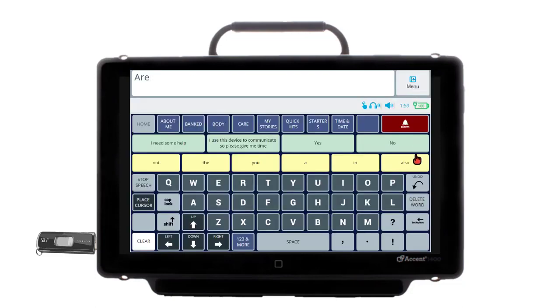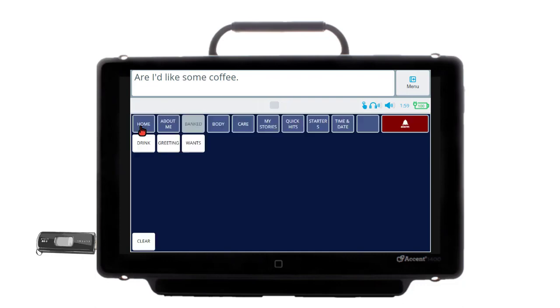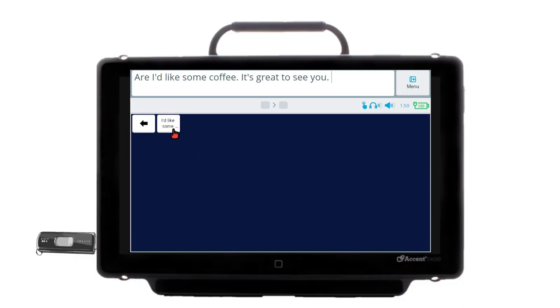Now, when I go to a button on my vocabulary that says Banked, I will see the tags from my recordings. I'd like some coffee. It's great to see you. I'd like some coffee.